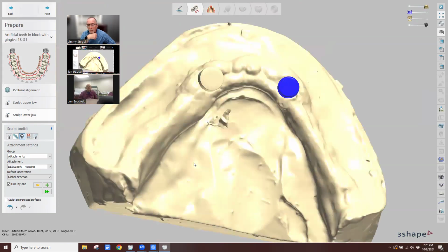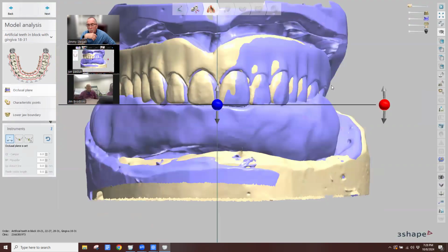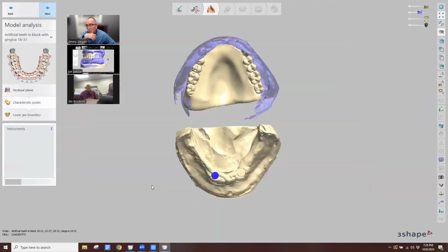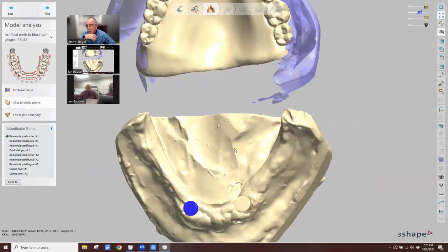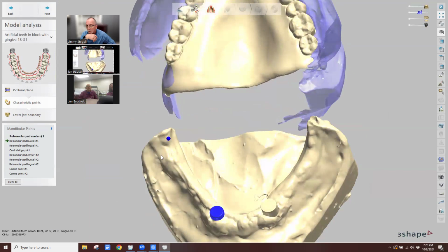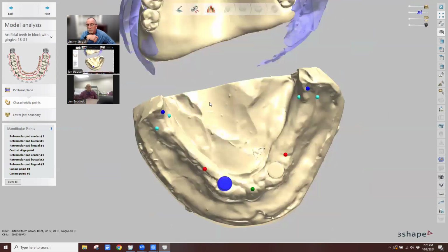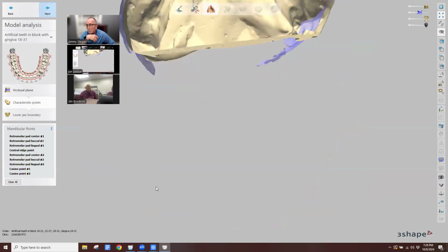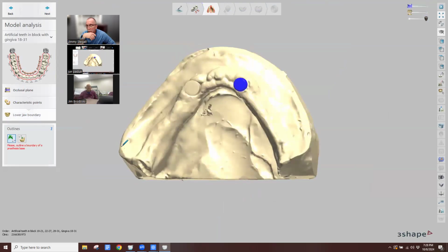I like my cylinder way, and after this, it's moved forward, and we're doing exactly what we've been doing with every denture out there. It's saying, hey, what are the characteristic points? What are my anatomical landmarks? Tuberosity, central ridge point. I'm sorry, retromolar pad, border for my denture.